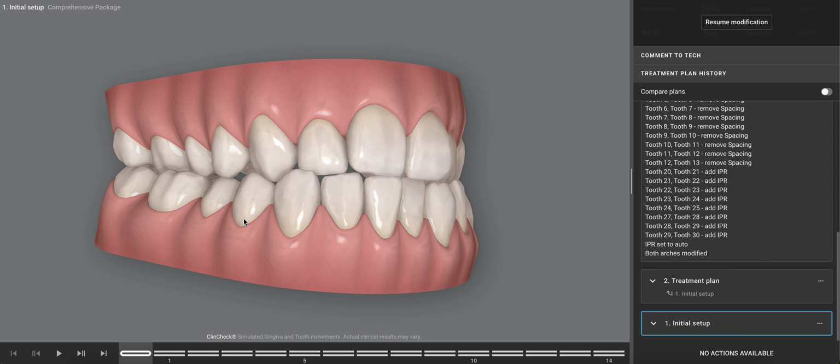That's hard to do. So I guess my point is there's always this trade-off that we're going to have as we're trying to optimize the biomechanics with the aesthetics. So there's an aesthetic trade-off much of the time. Let me just take another little step sideways and say, if we tried to fix this relationship here, the amount of tooth movement that would need to happen on these upper teeth would put the periodontal apparatus at high risk for recession, bony fenestration, instability, and so on and so forth.